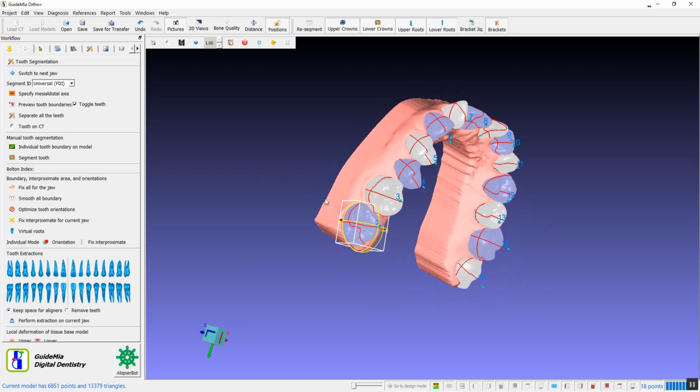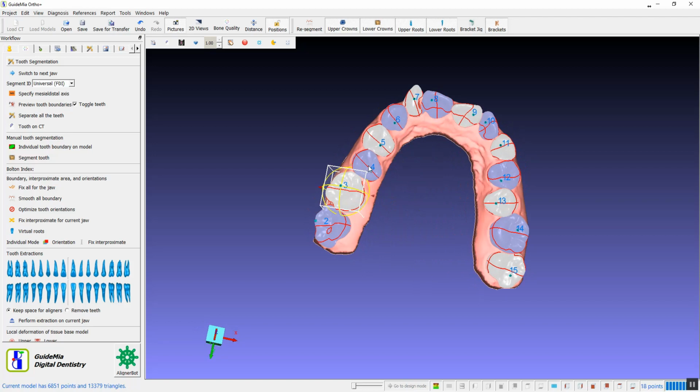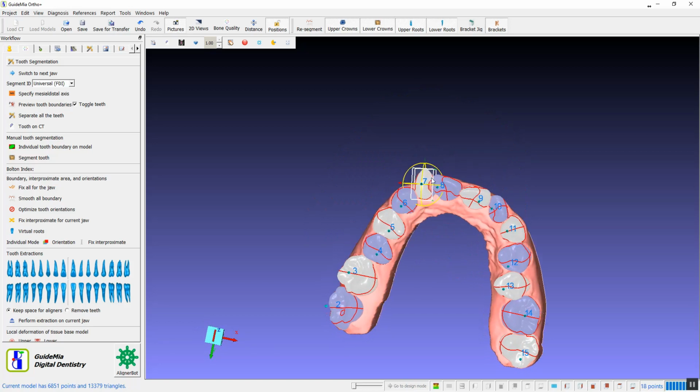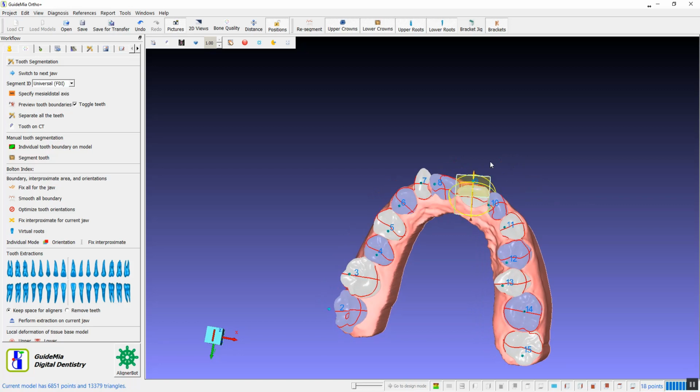After the fixing, we further investigate the tooth orientations and adjust them. Use the middle mouse button to select and show orientation widget. Rotate the view so that we can see a tooth from the occlusion side, and then rotate the bounding box to align with the tooth and view orientation. This way we can fix the tooth orientations one by one.